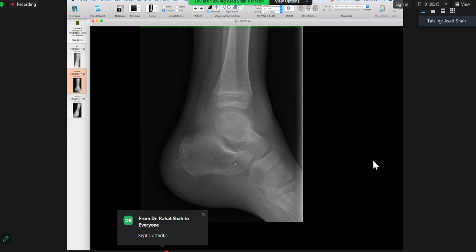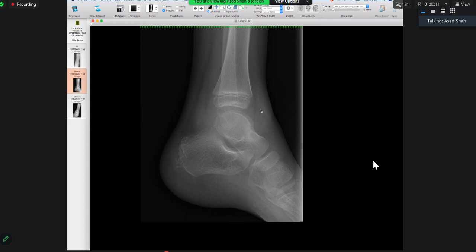Yeah. So always think, when you see things around the joint, is it in the bone or is it in the joint? And the joint can get infection, can get inflammation. They might have a UTI and they got reactive arthritis in that ankle. Or this might be the first presentation of somebody who's got juvenile inflammatory arthropathy, like child onset rheumatoid arthritis. Yeah, it's not that uncommon.